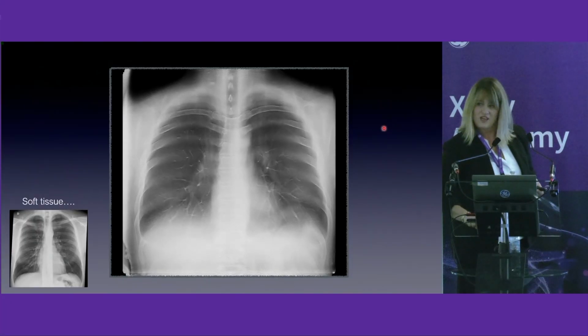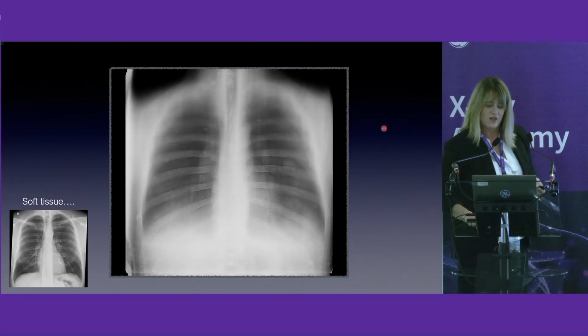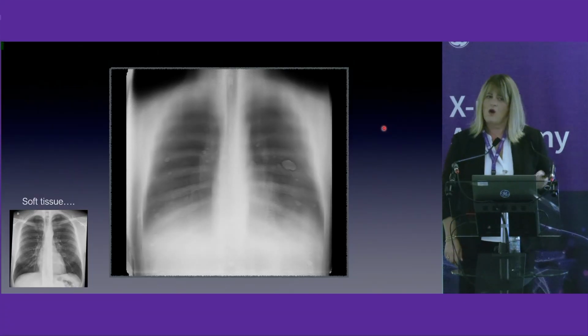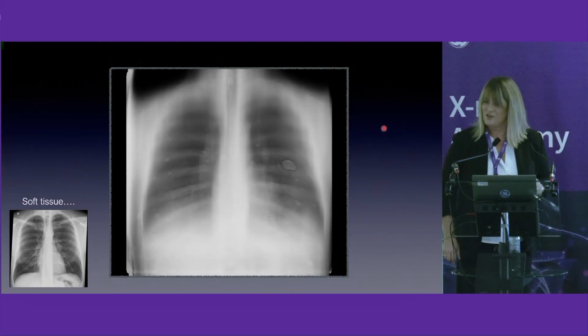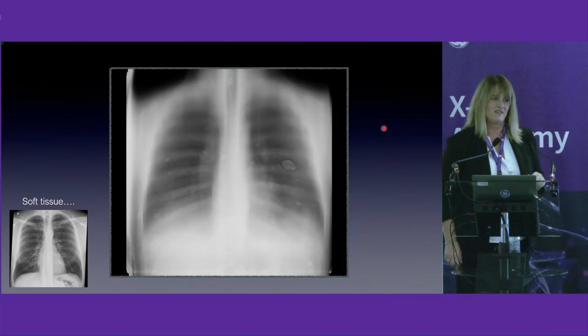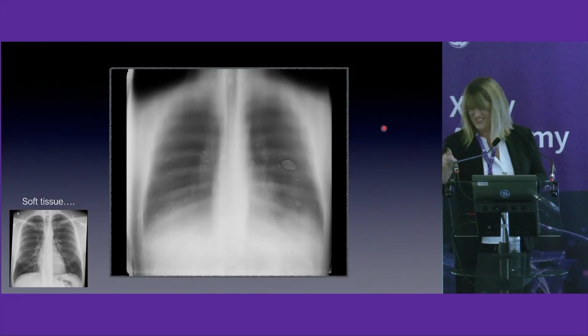Just scrolling images, 50 or 60 images, we move into the posterior part of our chest, and all of these opacities were due to skin nodules because this patient has neurofibromatosis. Okay, impossible to say on chest X-ray, but not for you.